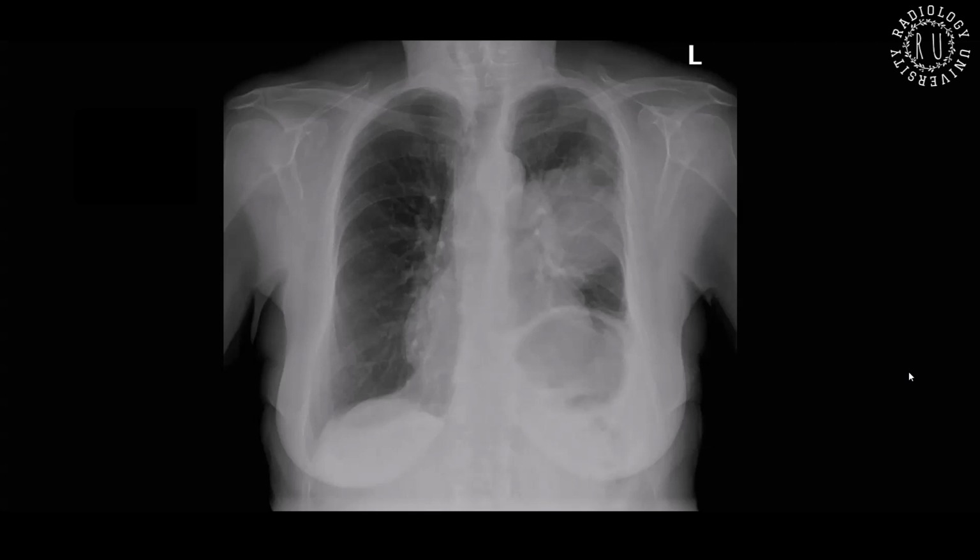This chest X-ray shows an acute-angled left mid-zone mass with a reduction in the left lung volume, as evidenced by the elevation of the left hemidiaphragm. This raises suspicion of an underlying malignancy, and I would like to refer these patients for a contrast CT thorax for further assessment.